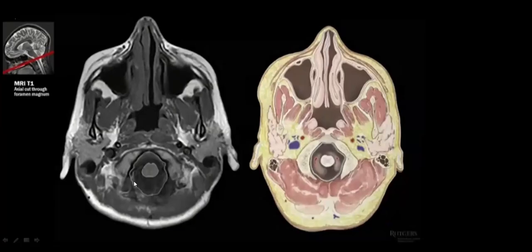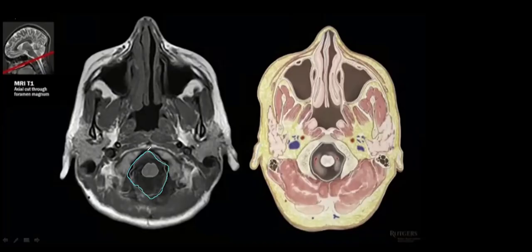What is this one? Basal. Yes. I am marking it. What is this one? And where has this cut been taken? To the foramen magnum. Foramen magnum, very good. So this is the foramen magnum, centrally placed.